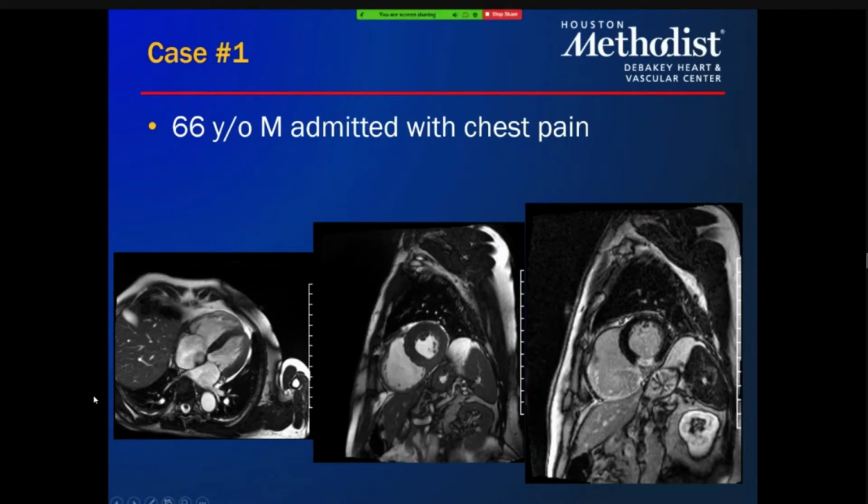So on the LGE on the far right, basically there's a transmural infarct, looks like, in the inferior wall that I can see. Also, when you look at the wall motions, the mid-inferior, because we see the papillary muscle of the mid-inferior does not move as well as the other walls. Looks at least severely hypokinetic from this picture. I mean, I need another picture.